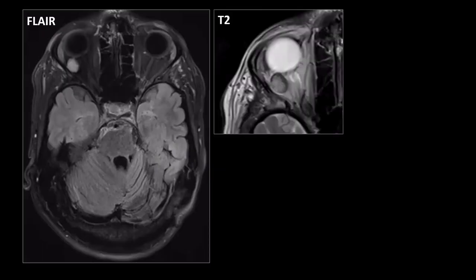Now, this is a very frequent finding, but often incidentally, it's often overlooked. You have to look at the eye on every MRI of the brain, and it's sometimes a bit of a forgotten area, especially when patients come for something completely unrelated. But if you look systematically at the eyes on each and every brain scan, you will pick them up every now and then.